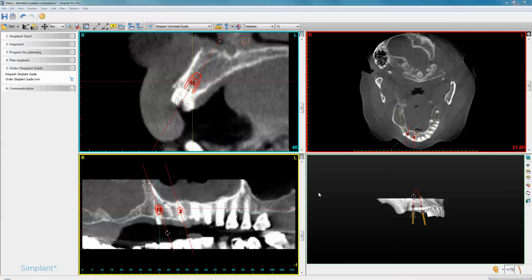Hello everyone, in this video tutorial I'll be going through how to upload STL models without using the optical module, and this is done during the ordering process. So if you're struggling to merge the files yourself or you do not have the time to do it, all you need to do is upload it on the website. So I'll show you how you can do that now.